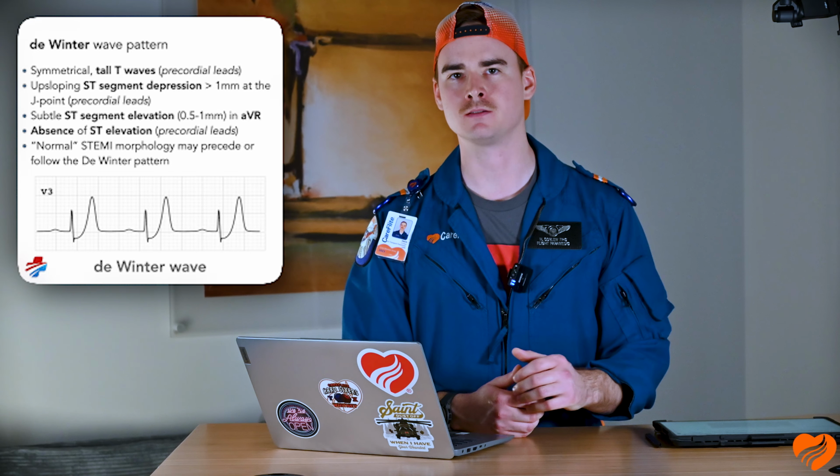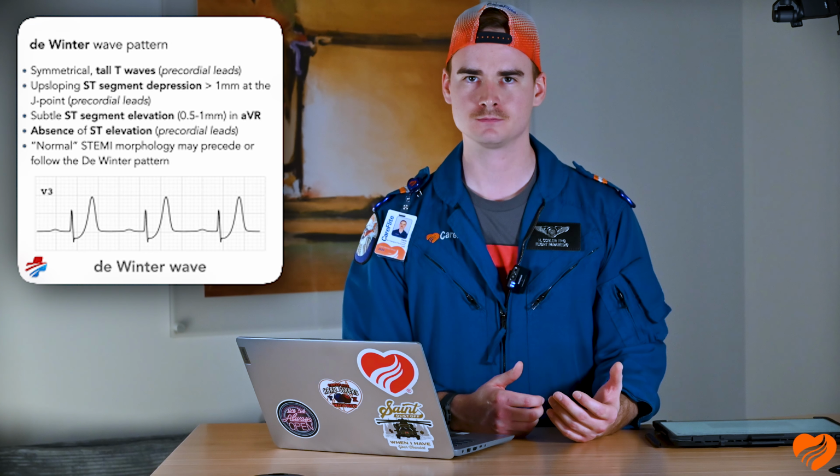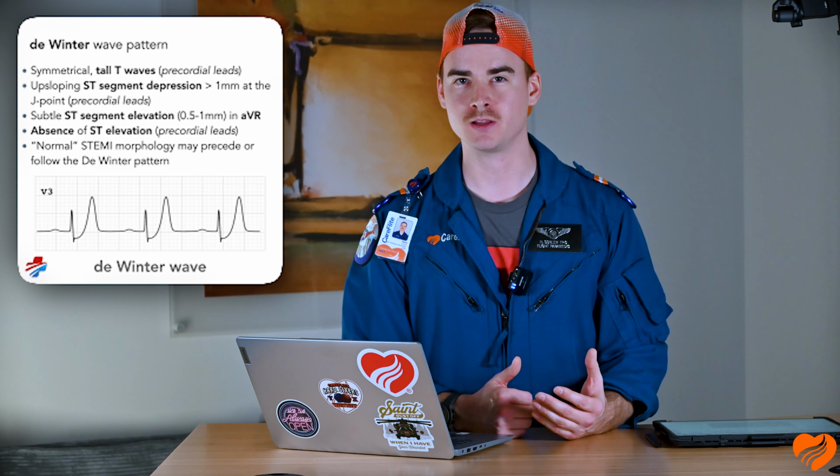Now let's roll on into the De Winter's pattern, which is considered an anterior MI equivalent. With your De Winter's, you're going to have tall, prominent, symmetrical T waves, generally in your precordial leads, that's V1 through V6. You'll find that upsloping ST depression, and you may also even have ST elevation in the aVR, generally 0.5 to 1 millimeter, fairly subtle. This pattern is often seen in younger male populations, generally around 40 years old, and may precipitate a dangerous arrhythmia.